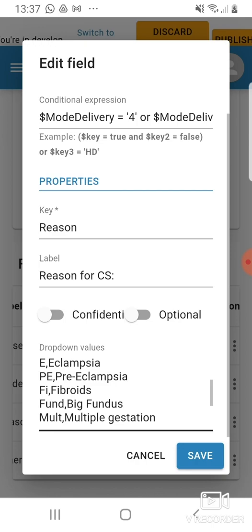So as you work through the more complicated scripts, then you may see much more complicated conditional expressions, but they all follow this basic form, which has a key, has an argument, and whether that argument is satisfied or not, it either activates an option or an entry or triggers a management page.